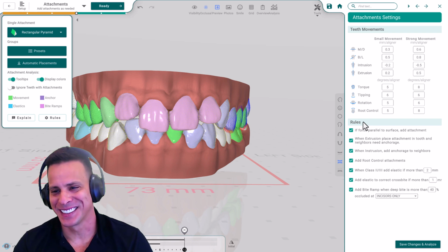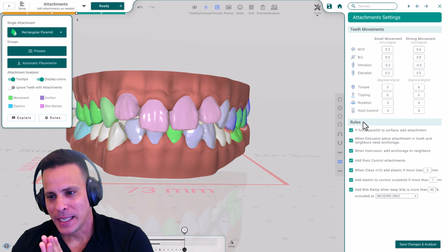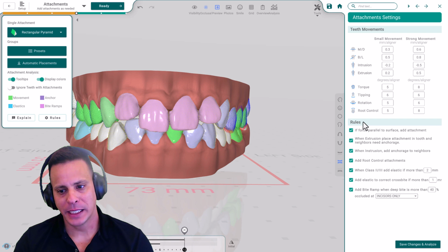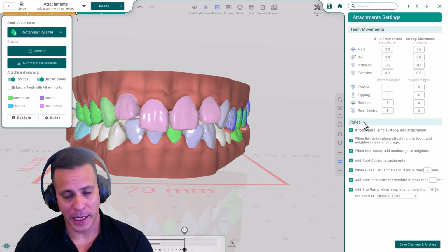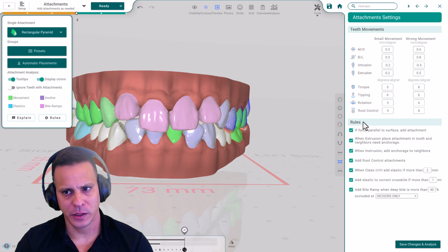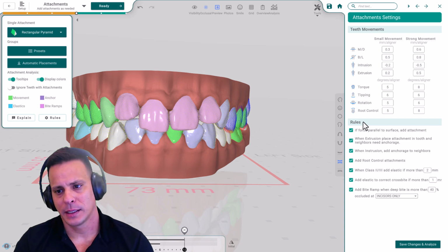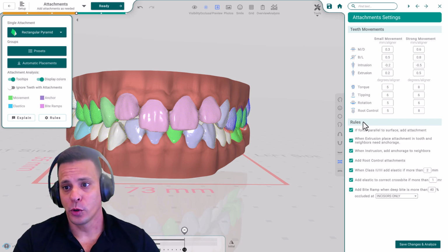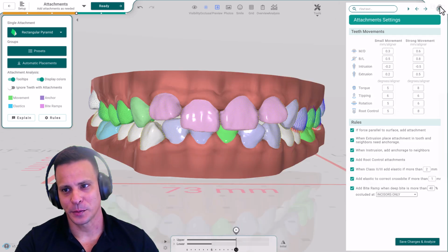It's going to be fun. But yeah, tweak these numbers, play with them, let us know what other rules you would like to have included, and let's try to find out protocols for everybody. But this is meant to help you. Oh, and moreover, this is all fun surprises.